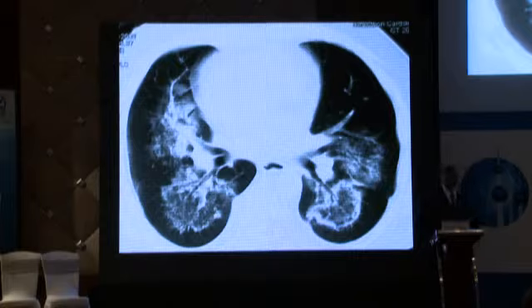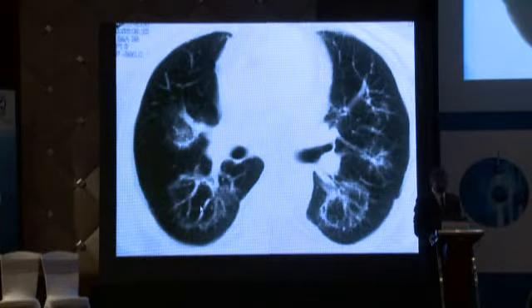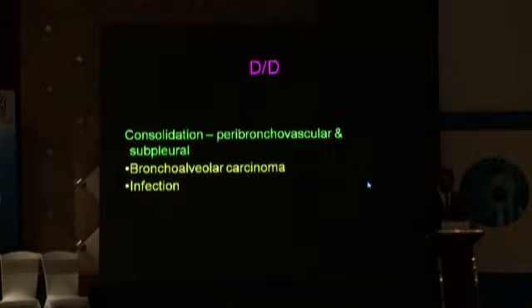This is another interesting pattern that presents with an organizing pneumonia or a BOOP kind of appearance, and we call this the reverse ground glass. So we have the ground glass in the center with the consolidation at the periphery. Normally you get consolidation in the center and ground glass at the periphery in virtually all the pneumonias, but sometimes it's the other way around. We call it the reverse ground glass halo or the reverse halo sign, and again reasonably pathognomonic of a BOOP pattern. And after treatment you can see how beautifully the lesions regress. Kind of looks like an abstract art painting, and it's very interesting to see some of these.